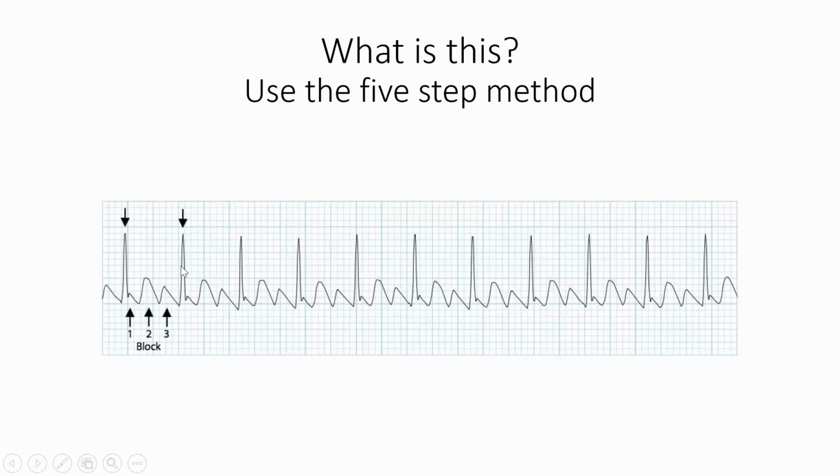Okay, so let's try this one, guys. I'll give you just a minute to see what you come up with before we go over it.